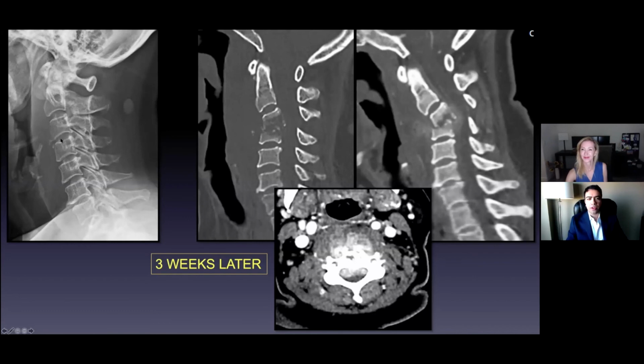But you don't need to have a spinal surgery background or a neuroradiology background to know something looks very abnormal there. What you see here is pretty characteristic of osteomyelitis, discitis, and an epidural abscess around the C3 and C4 vertebral bodies. You can see there's destruction of C3, there's collapse of the vertebral bodies, and there's kyphosis that's developing above, okay?